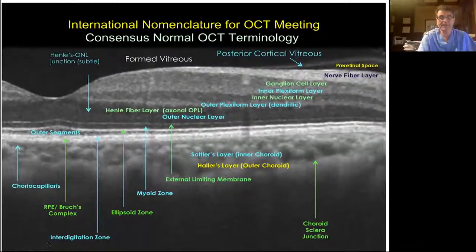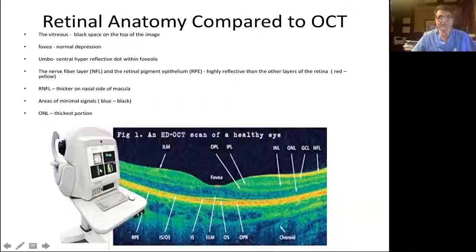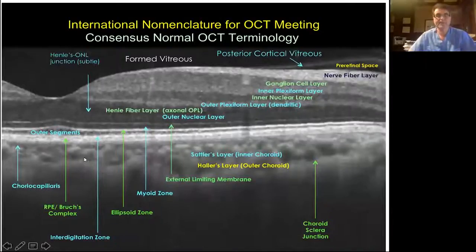This is a more highly resolved image. It's really quite a beautiful image of the retinal anatomy. And once again, just to orient everybody, we see the fovea as this depression. Again, the papulomacular bundle, the nerve fiber layer of the papulomacular bundle.